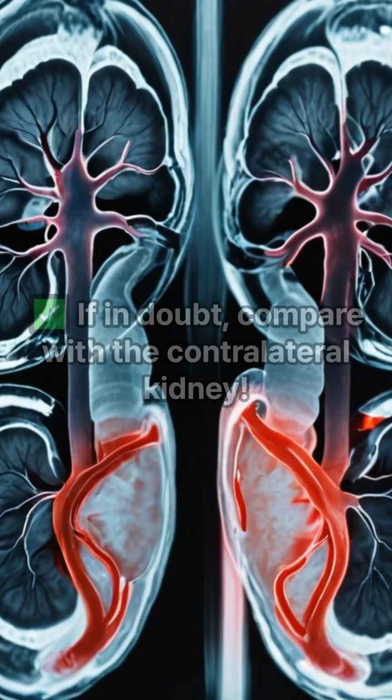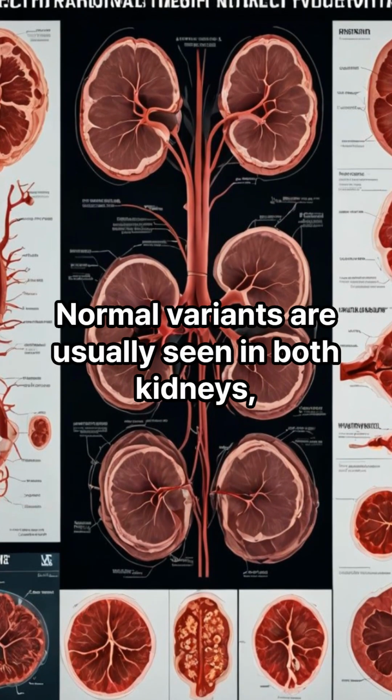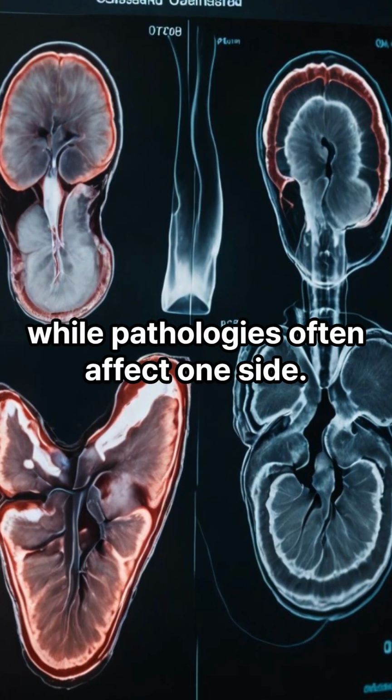Final tip: if in doubt, compare with the contralateral kidney. Normal variants are usually seen in both kidneys, while pathologies often affect one side.